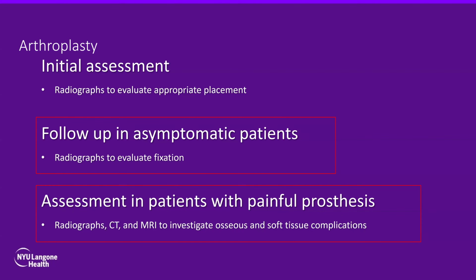So in this talk, I'm not going to be talking about the immediate post-op positioning of the radiographs. That by itself is a separate discussion. But I will touch base on the 2 other areas where we use hip radiographs.